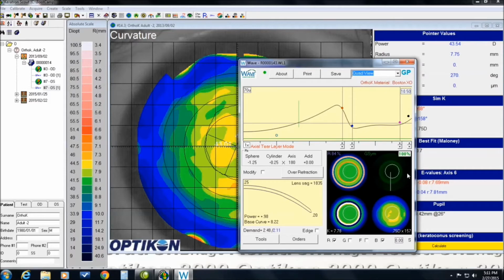Now I've got an apical clearance of about 8 or 9, which is okay. So I feel like I get a better result when these two are closer to the same height right here, and let the apical clearance right up a little bit.